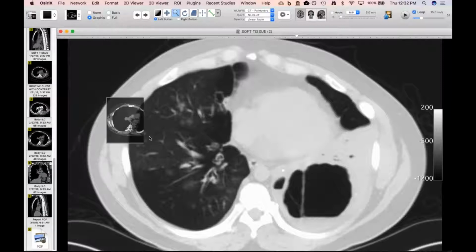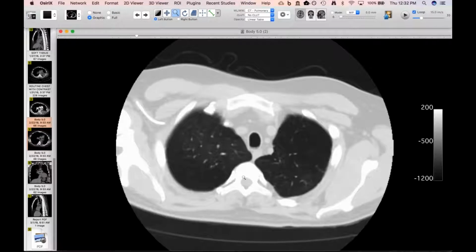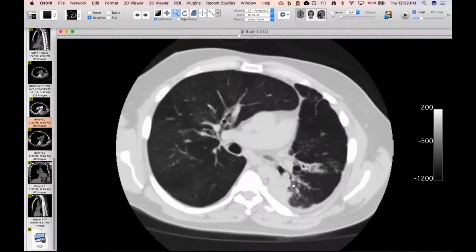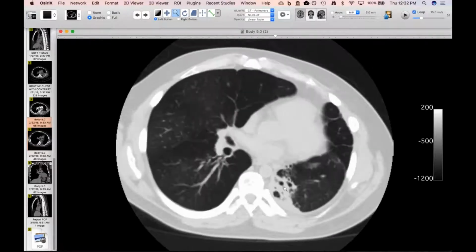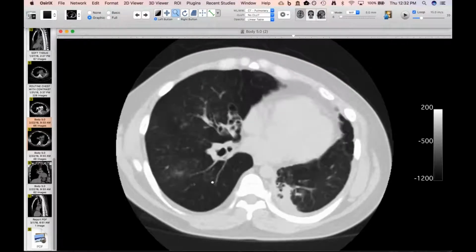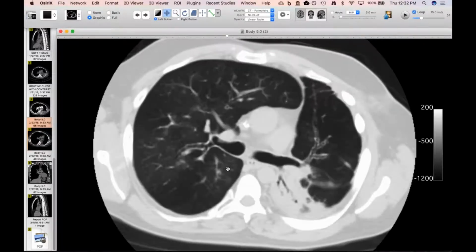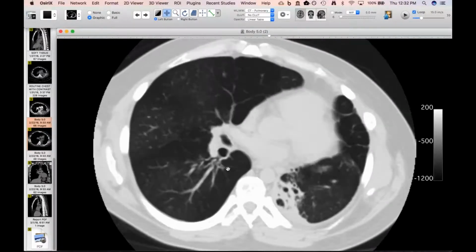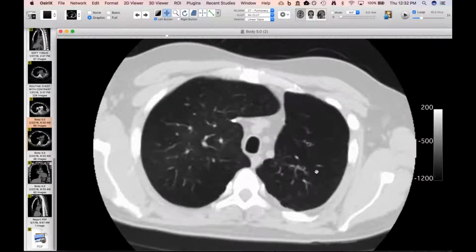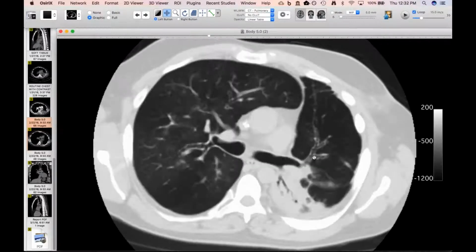He spent a long time at the other hospital, and then he came to one of our infectious disease specialists last week in follow-up after he'd gone to surgery, had a decortication, and they were basically referring him for evaluation of what antibiotics to put him on. And when I saw this, I instantly was thinking that there's something chronic going on here. He'd had a history, quote, of asthma, but to me this looked more like a Swyer-James type of picture with all of these areas where he has what looks like obliterative bronchiolitis and a lot of bronchial wall thickening.